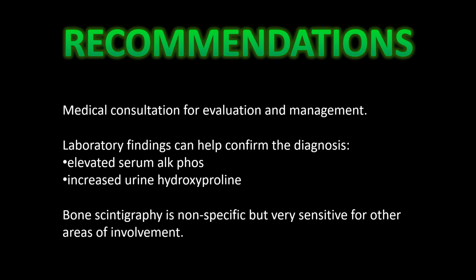So recommendations for this patient would be a medical consult for evaluation and management. There are many complications that can arise from Paget's disease, and these patients need to be medically managed. In order to confirm the diagnosis, laboratory analysis to include elevated serum alk-Phos or elevated urinary hydroxyproline can be helpful. And then for other areas of skeletal involvement, bone scintigraphy is a non-specific but very sensitive modality for finding those other areas of involvement.